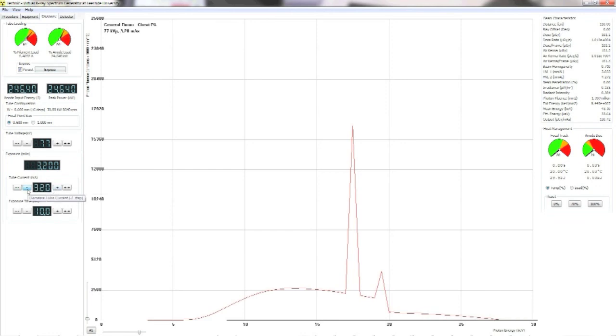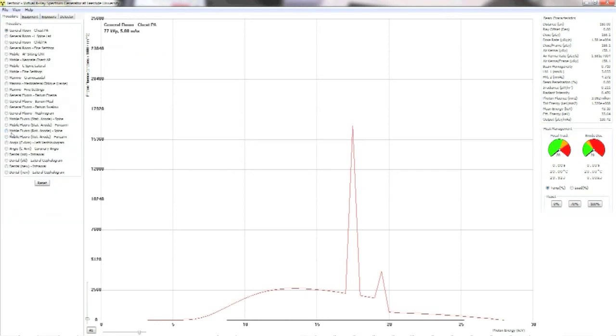Another separate display can be provided to show how anode temperature is affected by long exposure times when using a stationary anode image intensifier in theatre, for example. So, these are the three components of virtual radiography: Projection VR, Lecture VR, and Technic VR.